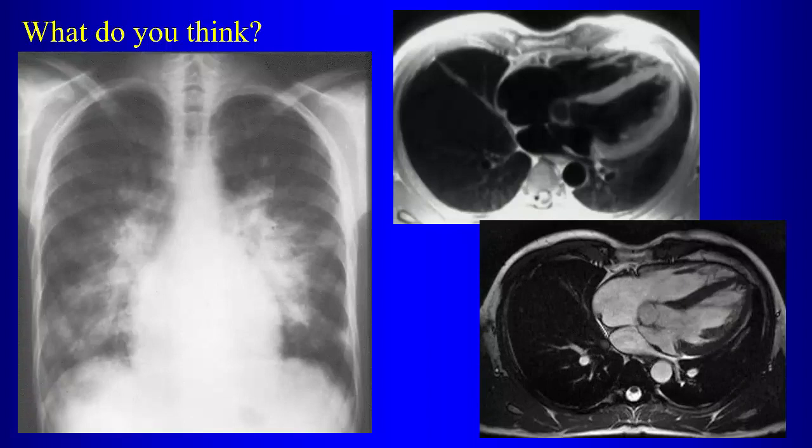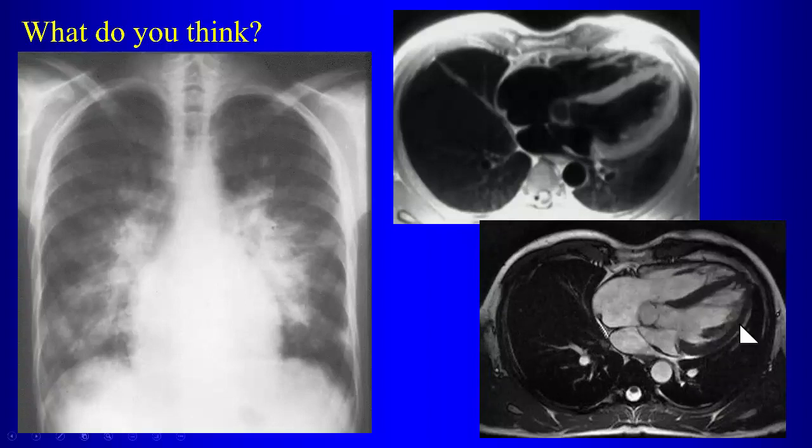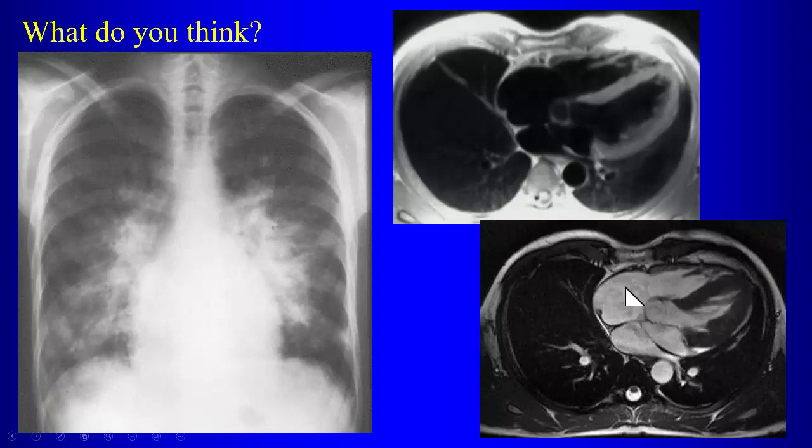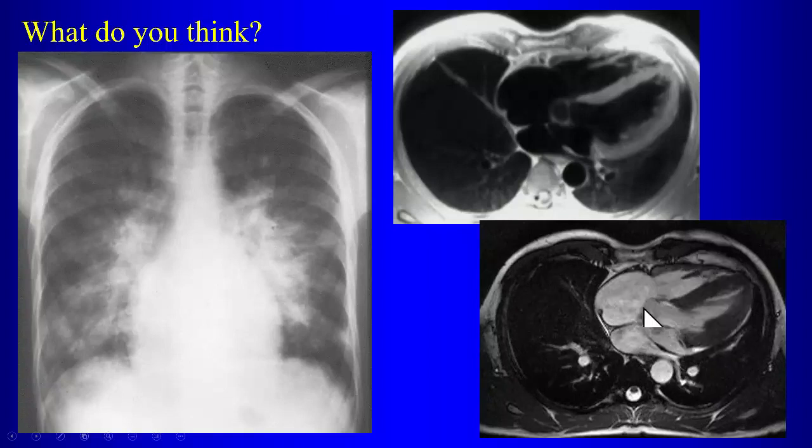Well, so this chamber over here is the left atrium, this guy over here. Right, and left ventricle, this guy over here. Right atrium, this guy over here. Right ventricle, this guy over here. That's the aortic valve going into the aorta.